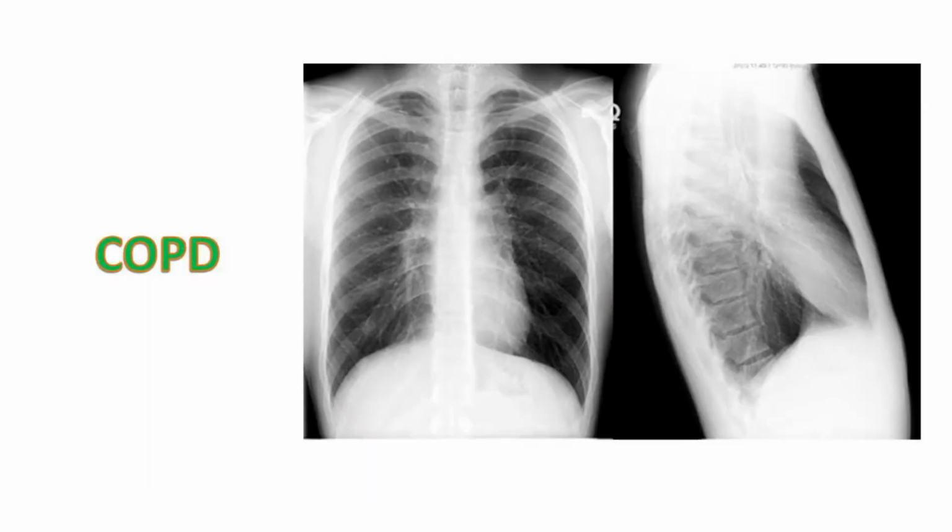This is chronic obstructive pulmonary disease, which we also call COPD. It is a chronic inflammatory lung disease that causes obstructed airflow from the lungs. It also causes inflammation of the lining of the bronchial tube, which carries air to and from the air sacs of the lungs. It causes people shortness of breath.